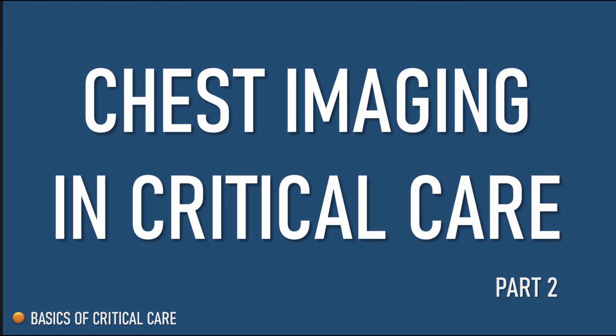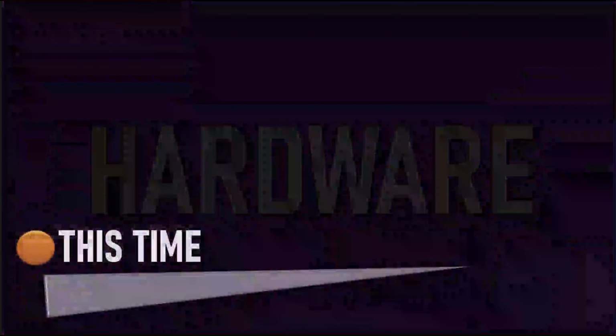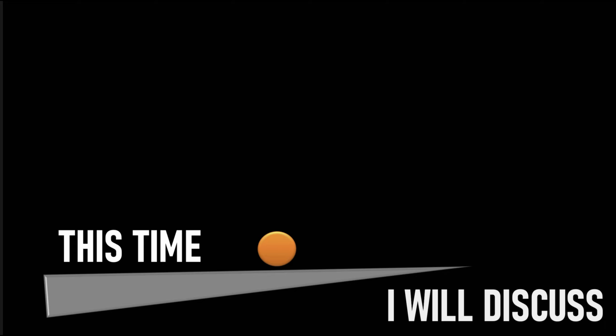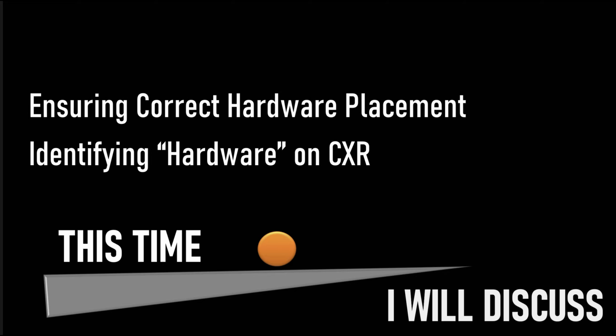Chest imaging in critical care, Part 2, Hardware. In this tutorial, I will discuss identifying hardware on chest x-ray and ensuring correct hardware placement. Let's start with breathing tubes.